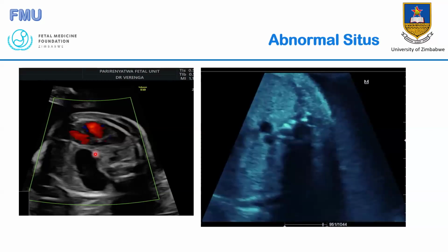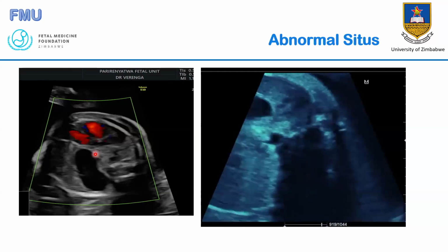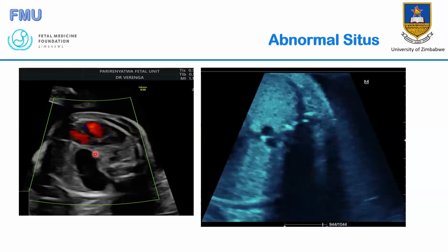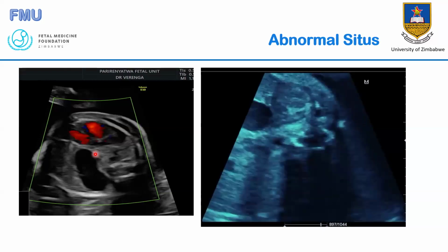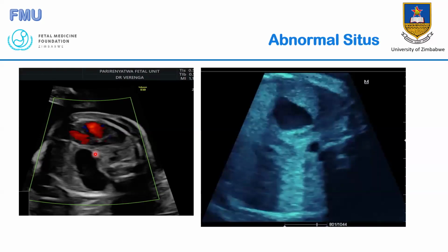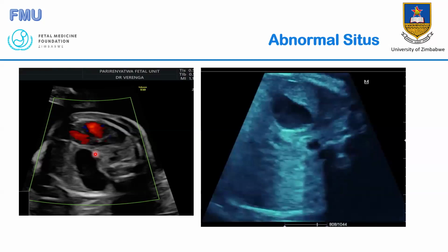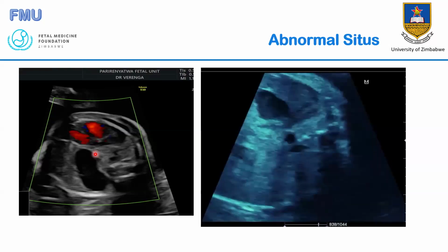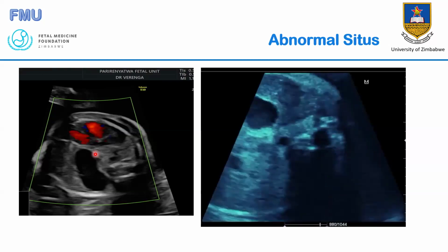What is wrong with the two images when you look at them? Any takers, please take your guess. You remember it, even if you don't get it right. Any guess, what is wrong with the two images? Right, let's see, the answers are coming.